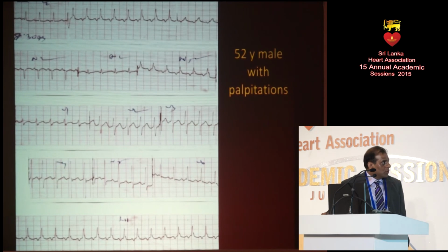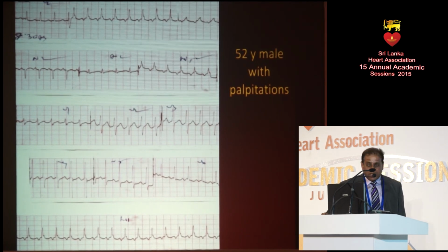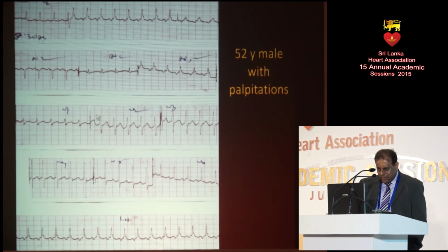The ECG shows a tachycardia which is narrow complex with a heart rate of approximately 150, probably slightly below that, together with inverted P waves. You can see the inverted P waves, and this is what we would call long RP tachycardia. Right? So for the long RP tachycardia, the first diagnosis is atrial tachycardia.